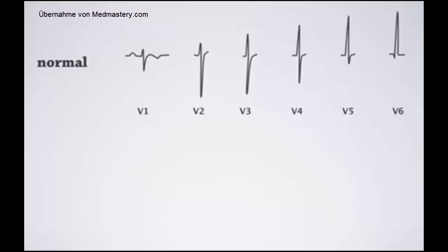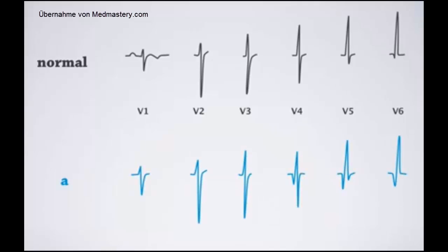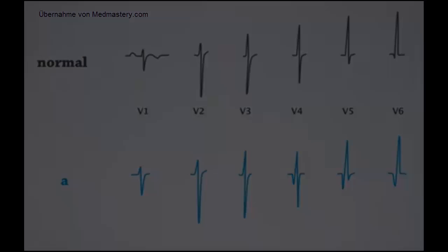Let's take a look at some examples. This ECG was taken from a normal patient. Compare that to ECG A. Can you spot the problem? Pause the video and think about the possible solution, and then come back and continue.